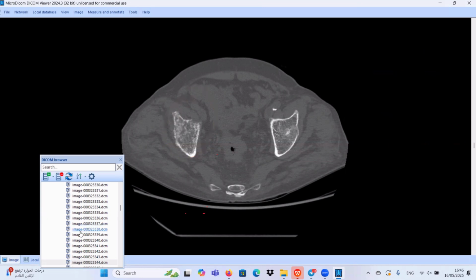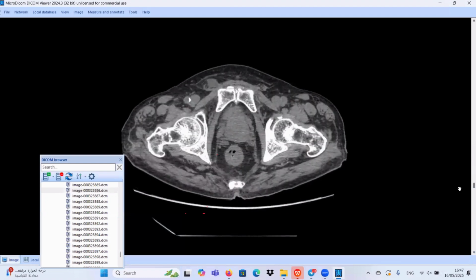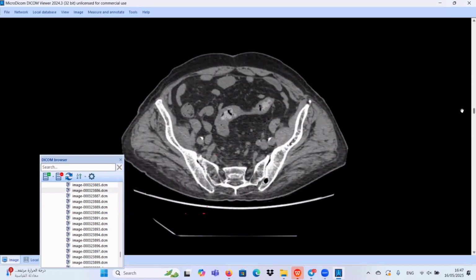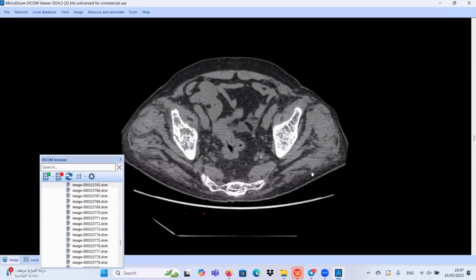causes for this case. And I agree with you that you started to search for the primary tumor. Prostate almost normal. But I think we have here something like mural thickening at the rectosigmoid junction. Yes, sir, I agree. Do you agree with me? Yes, sir, this is an area I'm not happy with.